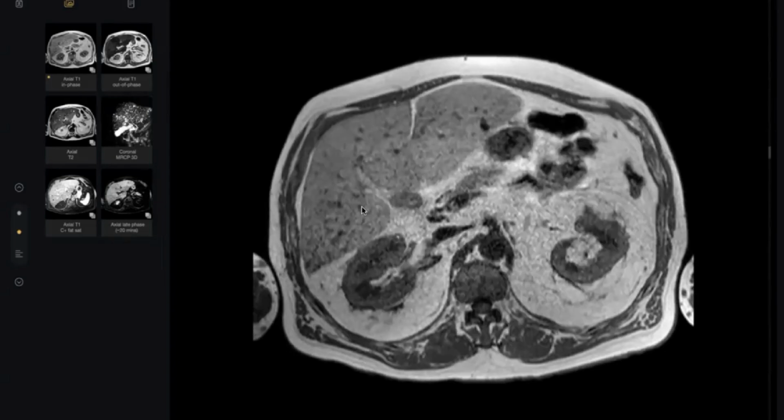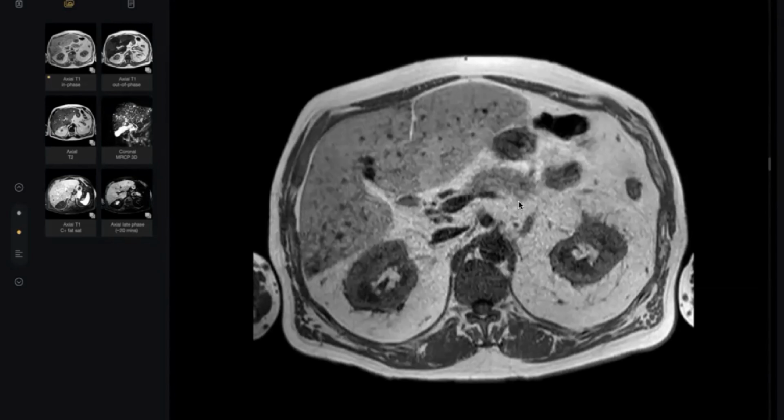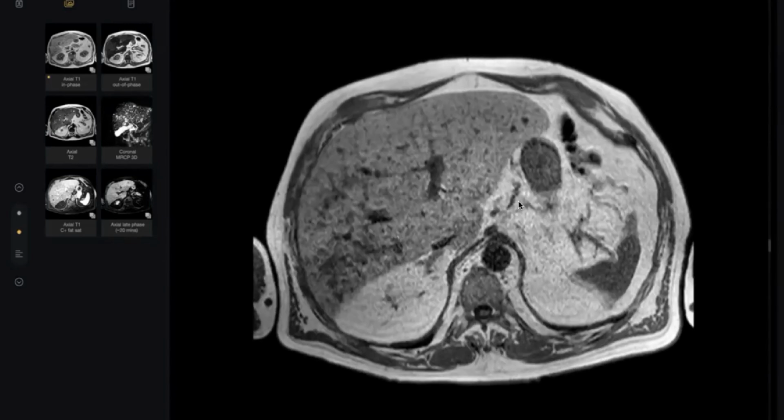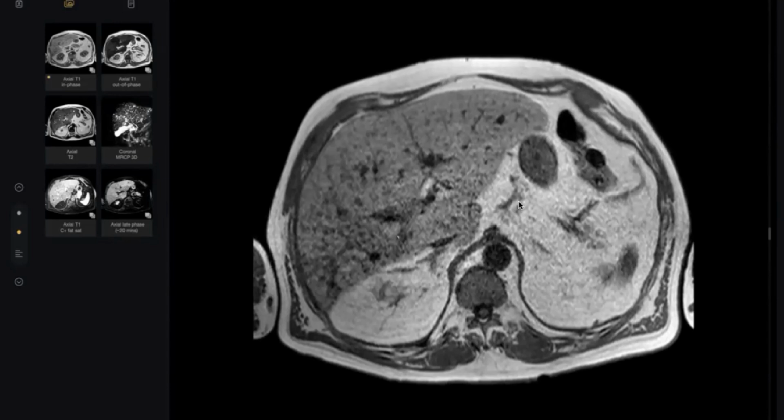So I have been provided with a T2 non-fat set image. I can see that the... Are you sure, doctor? It's likely T1. It's T1. Yes, sure, in the non-contrast image. I can see that the liver... Please scroll. I am trying to scroll. It's not happening. I'm sorry. No problem. Sir, can you scroll for me, please?